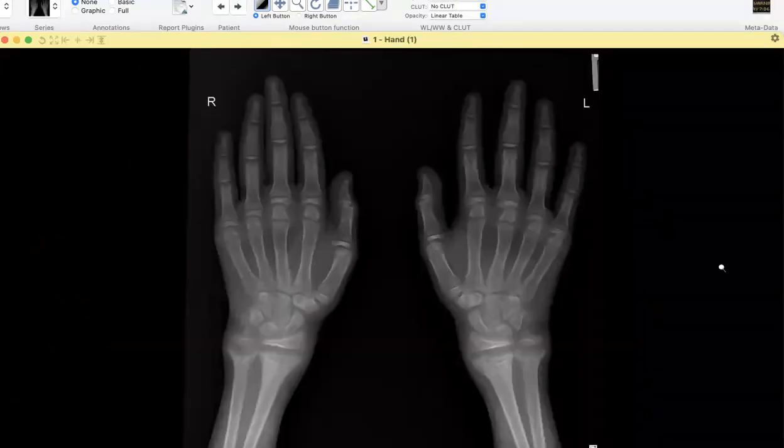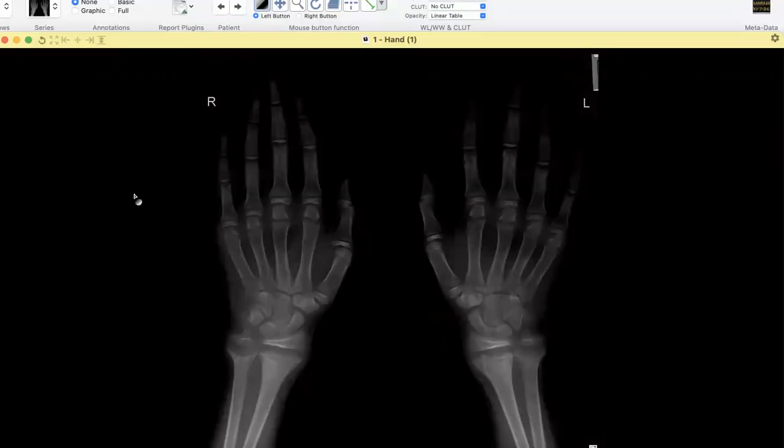There you go, Salman. This is a teenage boy. Radiograph of both hands, a frontal projection of a teenage boy, shows cupping and fraying of the distal radial and ulnar metaphyses, symmetrical bilaterally. Now I'm looking for any other abnormalities in the rest of the bones. Somewhat similar abnormalities are also there in the heads of the metacarpals bilaterally.